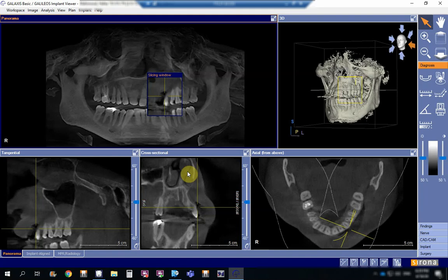This is because of the geometrical principle in the image acquisition. Regardless of the technique, whether extraoral or intraoral, all images are magnified except in the CBCT. In the CBCT, what we measure on the radiograph is exactly similar on the patient's tissues or structures, if we can say, because there is no magnification here. And this is in the CAT scanners, in the CBCT, as well as the MRI.